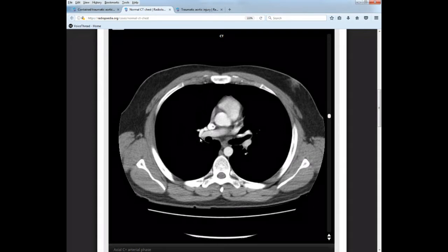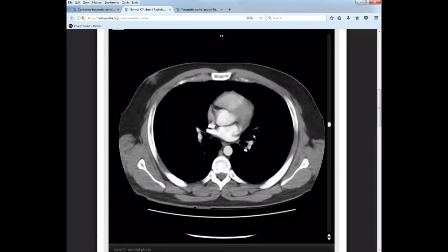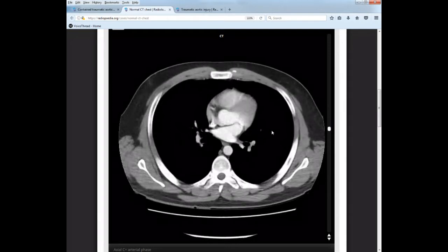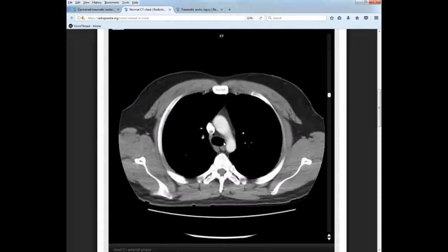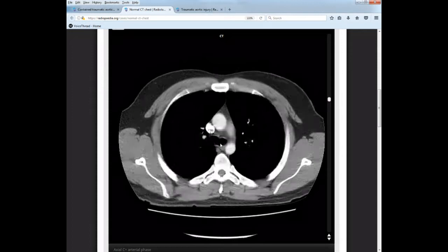So right main stem, still straight up and down. Left has now taken a shift over horizontally, so less chance of aspiration or foreign body invasion. The other thing I want to point out, remember I told you that locating the carina on a scout view is going to help you to visualize or see at about the level of where the pulmonary arteries are.